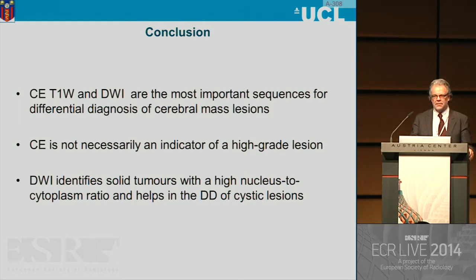And I think that's the images I always look first, contrast-enhanced and diffusion-weighted. But diffusion-weighting, always look at the DWI together with the ADC. I don't know whether any of you have machines who don't produce automatic ADC maps. That shouldn't exist anymore, but you need it.